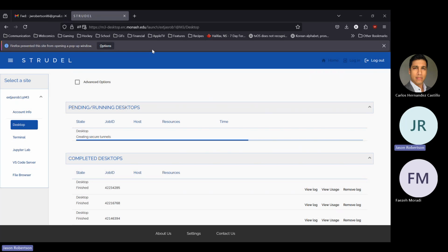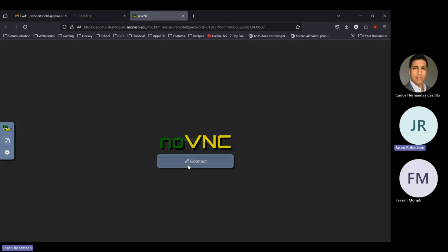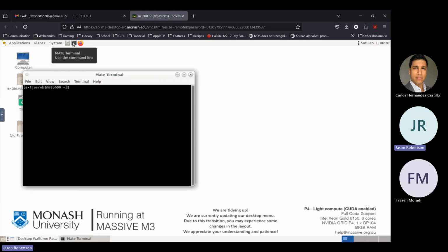This is Massive, which is the Australian server, the server where all the data I work with is stored, because our collaborator is in Australia. That's where our part of the project is sort of run out of. So SPM, like I said, runs in MATLAB.